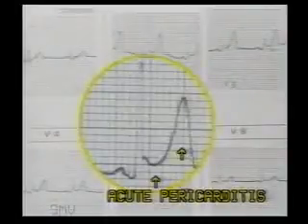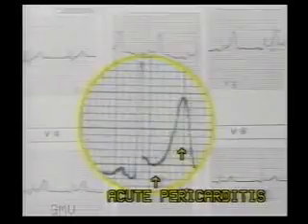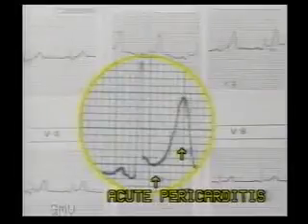Though sometimes all leads may not show ST elevation, causing a confusing picture, reciprocal ST depression will never be seen in pericarditis. So reciprocal ST depression rules out acute pericarditis.